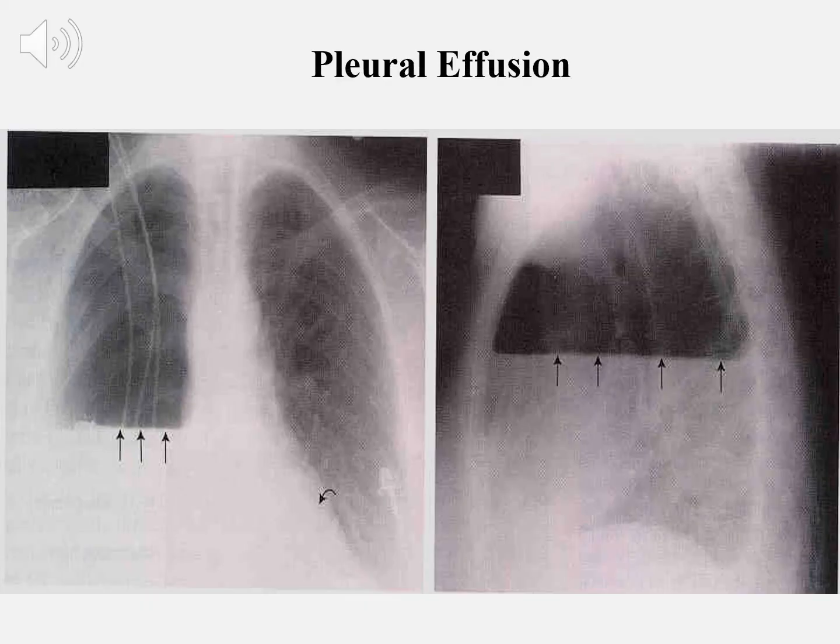Pleural effusion on chest x-ray. This looks to be a posterior anterior erect and lateral view. You can tell it's erect because the fluid volume has descended into the right lung space. This is a definite walled off effusion. You can see the lateral view where it does the same. This is very easy. This is a very large pleural effusion.